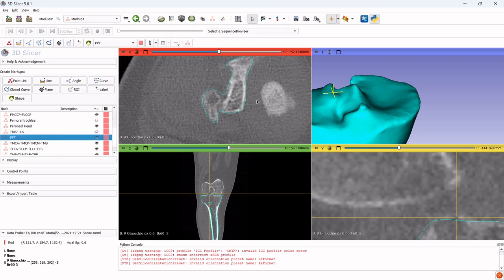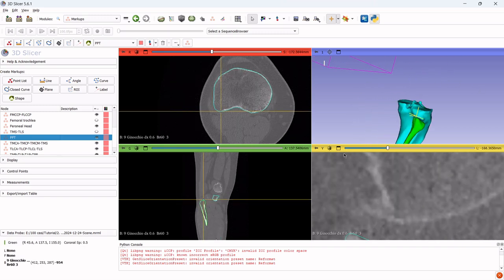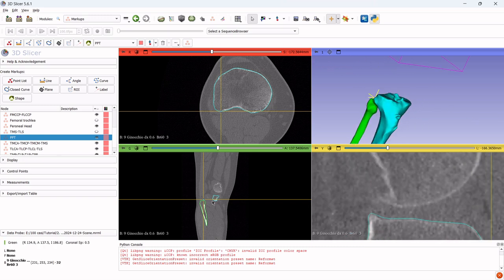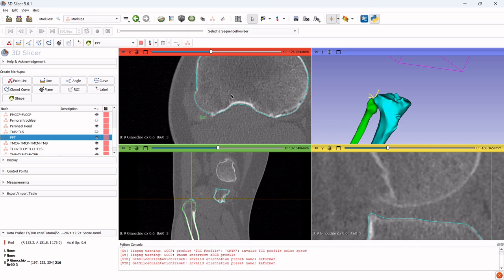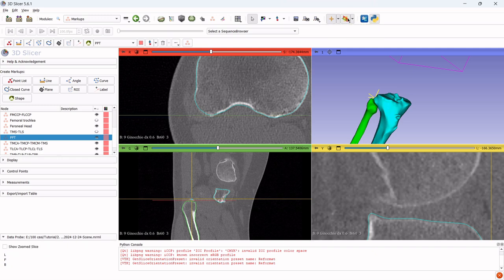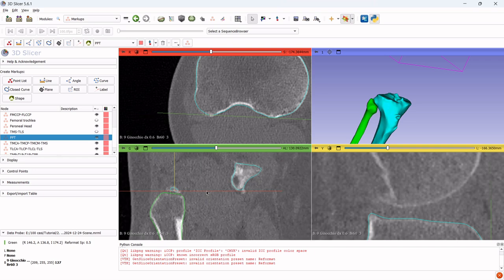Next, select PPT, posterior proximal tibial, which we define as the most posterior point of the tibia on the axial slice just above the fibular head. Again, the purpose is to draw a tangent line at the posterior aspect of the tibia, which will be used for the calculation of tibial torsion. To do that, once we find the right axial slice just above the peroneal head, we toggle on the MPR and interaction buttons. We select the medial or lateral most posterior point, and on the axial view, we rotate the coronal plane, the green line, until it is tangent to the posterior aspect.